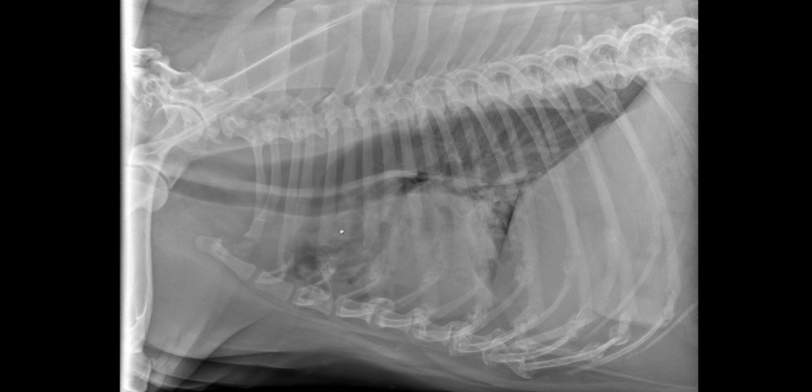Then the second important finding of those radiographs is the pulmonary pattern that is visible. So there are severe pulmonary changes visible that appear as a diffuse increase in soft tissue opacity. It's so increased in opacity that we cannot see really well the cardiac silhouette underneath. So it's hiding or silhouetting with the cardiac silhouette. So it's quite a dense pulmonary pattern.